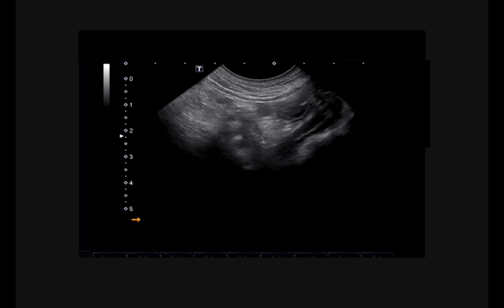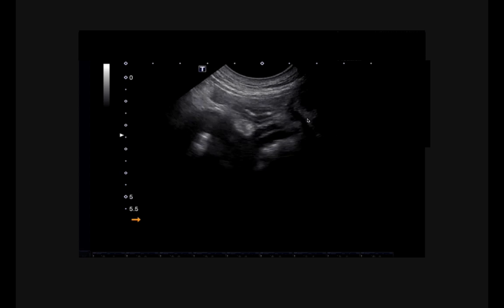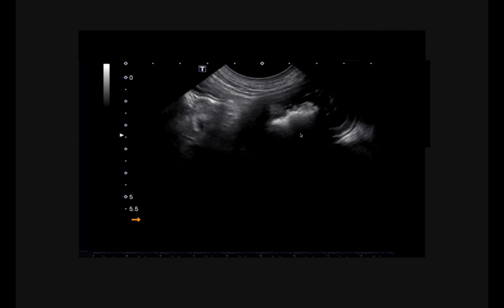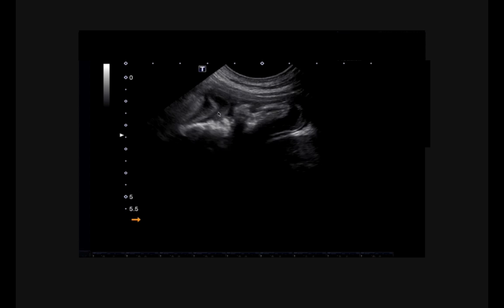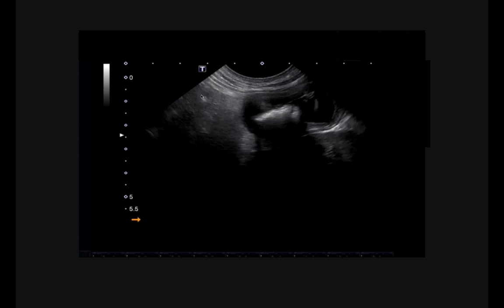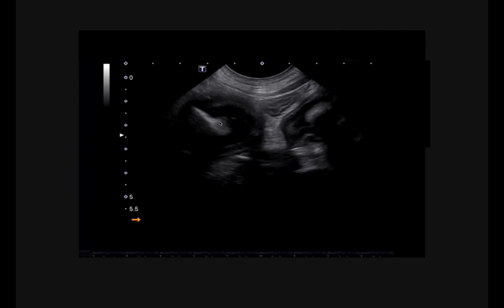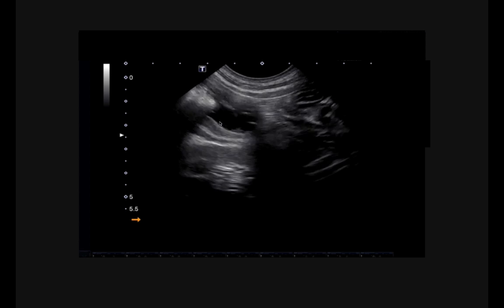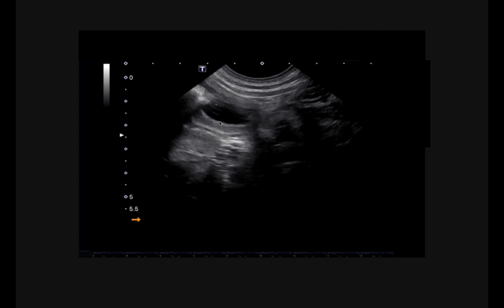We see bowel segment being mildly thickened and hyperechoic linear structure associated with shadowing seen in the lumen. If you observe, the wall of that intestinal segment is actually somewhat thickened compared to some other loops, and also at places the layering appears diminished. This is most likely the result of the localized inflammation due to the friction of the foreign body.